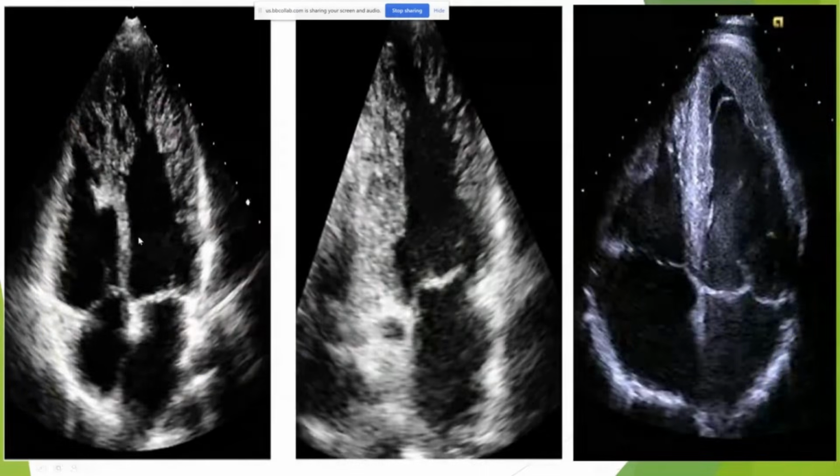So the trabeculations I was talking about, this is what they look like. Right here. See how the muscles appear striated and they're separated? They're not in one. This is what a normal myocardium would look like. And this is what trabeculations look like. Also, if they have an ejection fraction of less than 40%, they have non-compaction cardiomyopathy. So take a look at these muscles and take a look at this one. This definitely looks normal. These definitely are abnormal.